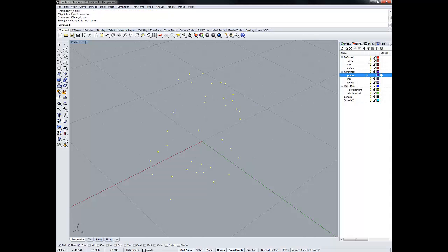And then I'm going to make sure that I'm working with that layer. I'm going to turn off this deformed layer just so I remember that I'm not working with it. And in terms of reference here, since I know I'm working with TLC occluded, I'm going to go in and type that into my deformed so I have a record of it for the future. And then my reference can stay as reference.